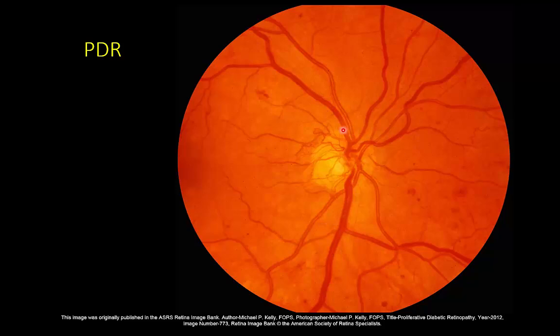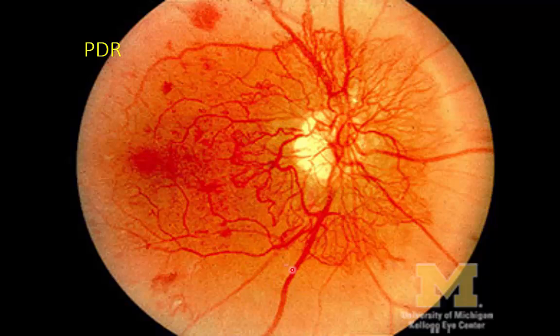And if we look at the optic disc, it's pretty sharp. We can see the vein quite well here. We can see the artery quite well here. But look closely, you see all these new blood vessels here. This happens later in the case of diabetes. Here's an example where it's really, really marked, where we have marked neovascularization. We can see our dot and blot hemorrhages. So in this stage, these blood vessels are very easy to break, cause hemorrhage, and then visual loss.